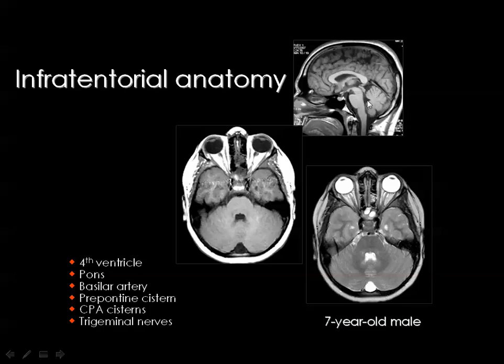The fourth ventricle is large at its middle part, and it is small inferiorly and small superiorly. When the fourth ventricle is large, then the largest part of the brainstem, which is the pons, is located in front of the fourth ventricle. When it is small from below, then the medulla oblongata is anterior to the fourth ventricle, while superiorly the midbrain is anterior to the fourth ventricle.